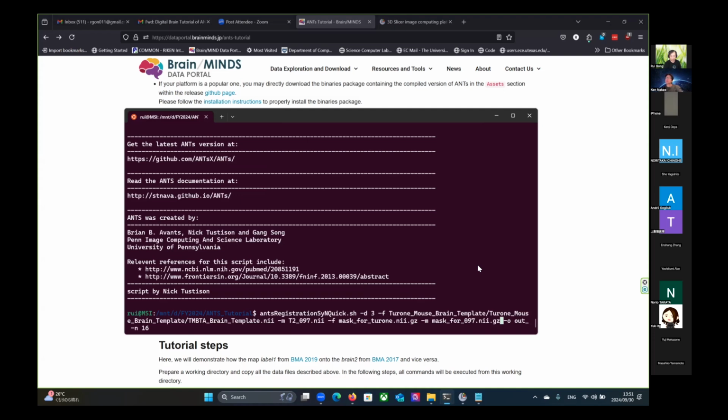The warp file is just where the pixels should move, in which direction. I think that's different from the volume. If you have a mask for the brain, I guess you can calculate the volume of the mask in pixels, then compare that, maybe. Sorry, I'm not very familiar with that. Okay. So if we look at the atlas, we can calculate the volume for each region.